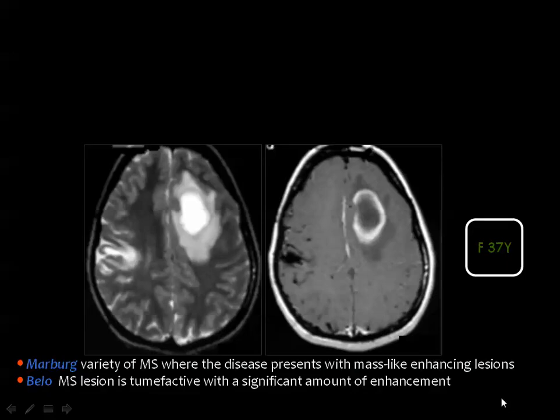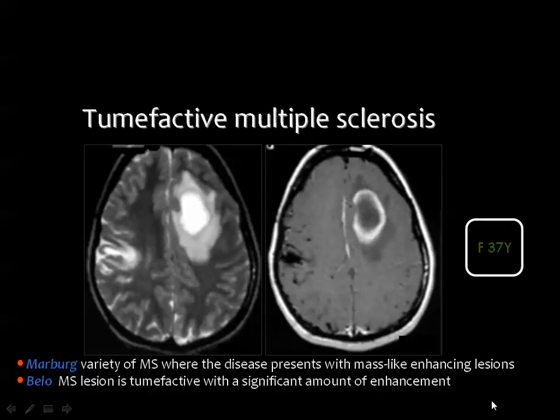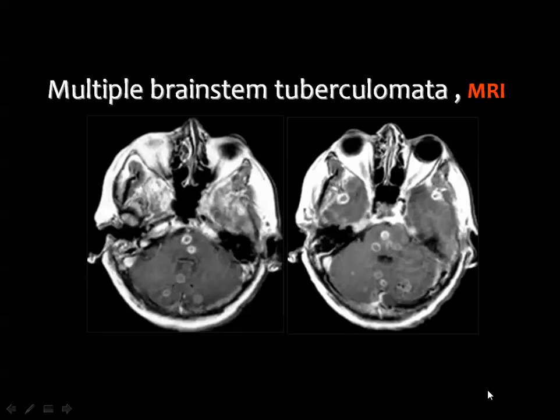Then you see the classic appearance of what's known as tumefactive MS, where you got big plaques similar to the tumors, and one of the characters of these lesions is the enhancing edge, which is not complete. And you can see here is the enhancement, and you can see the incomplete circle, which is almost characteristic for this type of tumefactive MS.